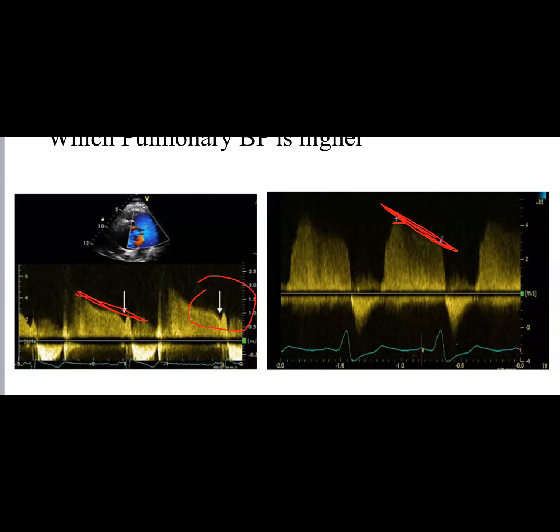Other thing, actually, this atrial dip or notch, when it's there, it votes against severe pulmonary hypertension. And when it disappears, it is severe pulmonary hypertension. Now, why is that? You see, this PR is a function of what? It's a function of pulmonary diastolic pressure minus what? RV diastolic. You agree with that, right?